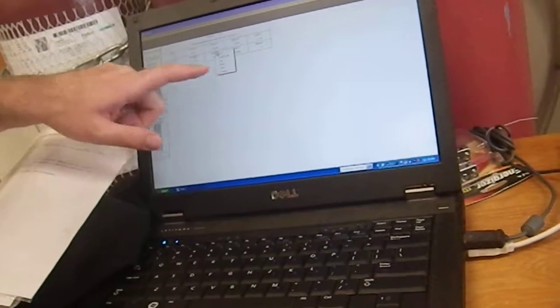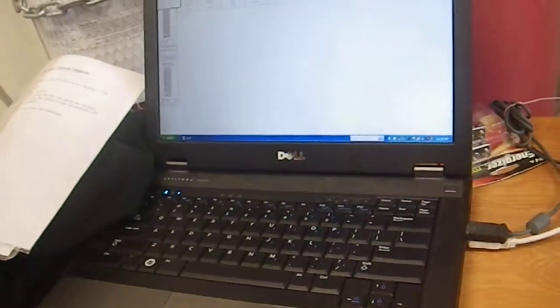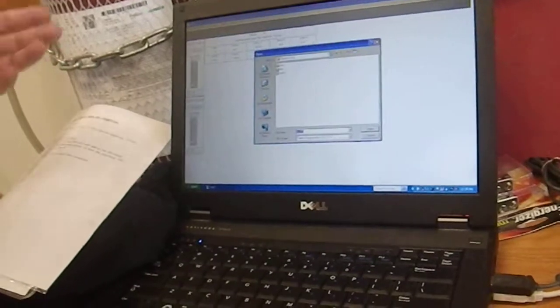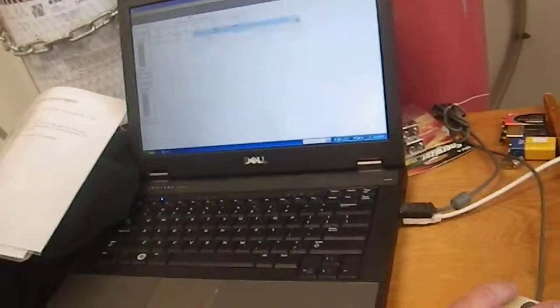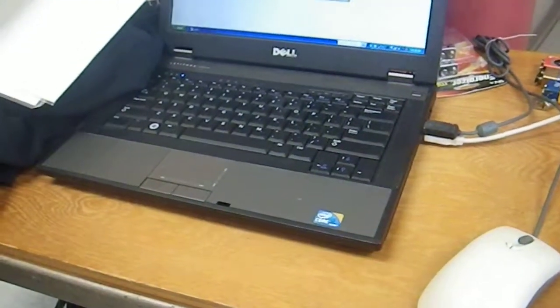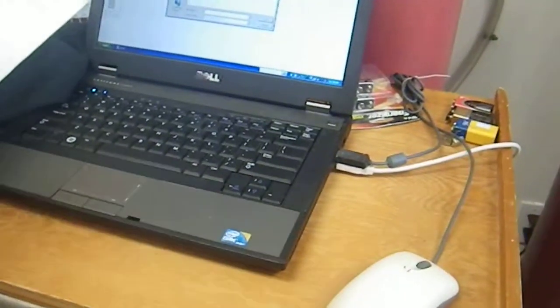So go log. Say I wrote the last file. If I right-click this, it would have that log check marked. Because I want to write a new file for the next participant or the next ride, I'll go File, Close. So this will be gray, meaning there's no file loaded. So you go back to playback, select your file, copy the file name, and then it'll open up again. Right click, log, select the name you want it to be, go through that process, and then you can go file, close, file, playback, deselect log, reselect log, pick your new thing, just repeat that.